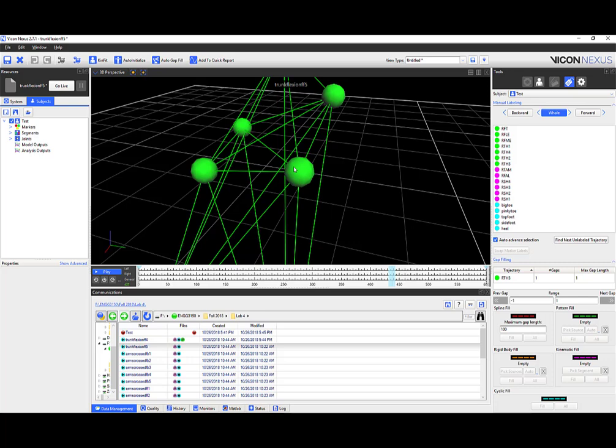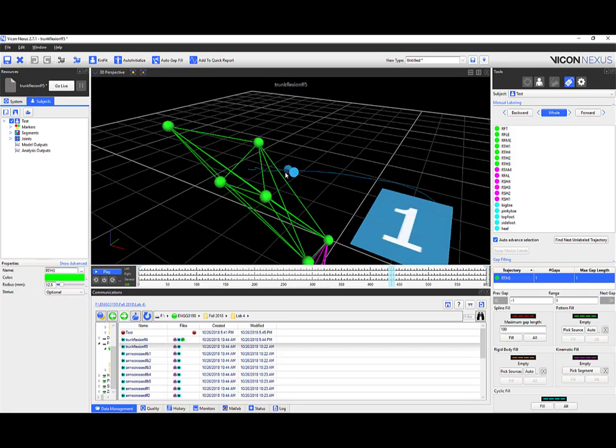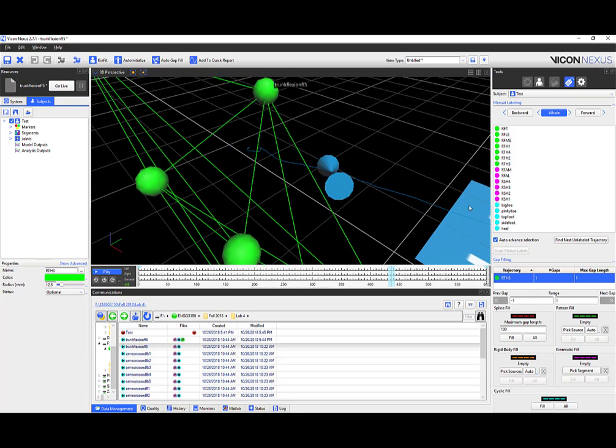So let's gap fill. To do that, I'm gonna choose that marker again. And I'm gonna go to, so these are the different algorithms and techniques that VICON uses. I mean, each of them are special in their own little way. I've always been comfortable using the pattern fill technique. You guys can definitely explore the other ones, but to make your life easy, let's just stick with this algorithm, this technique. So we're gonna go ahead and select a donor for our missing marker. That way we can fill it up. So I'm gonna go to pick source. It says select a donor trajectory for the copy pattern algorithm.